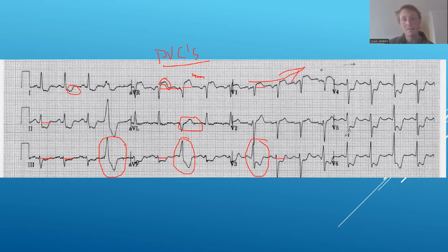But anyway, moving on, digressing again, we got pretty global ST depression. Some of it's quite substantial. Good R wave progression, but anyway, so what does this all mean? ST elevation in AVR with global ST depression. Traditionally, this has been associated with, and what I was taught, left main coronary artery disease, or occlusion rather, or triple vessel disease, or rate-related endocardial ischemia. And that's still more or less what this pattern represents, with some caveats.